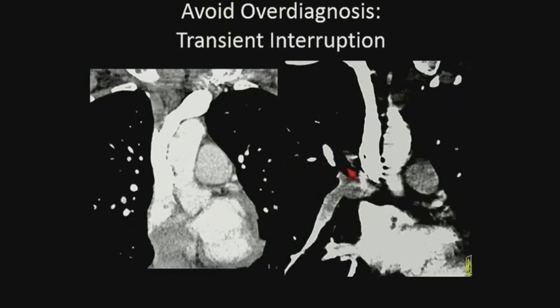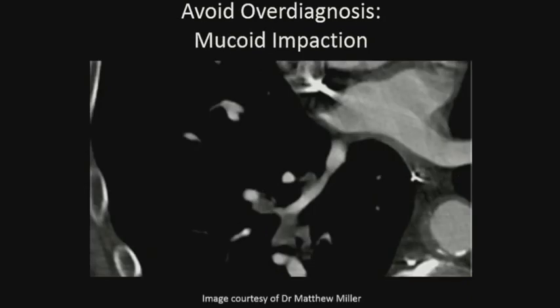This is another case of a pregnant patient with dyspnea in the 3rd trimester of pregnancy. The CT shows an ill-defined area of low attenuation in the interlobar artery, and the coronal reconstruction shows a large bolus of unopacified blood in the right atrium. This supports the suspicion that this is actually transient interruption of the contrast bolus by unopacified blood that has been sucked up into the right atrium, and is a common artifact when a vigorous deep inspiration is performed by particularly pregnant patients. This can be minimized by careful patient coaching to encourage a shallow held breath rather than a deep held inspiration.